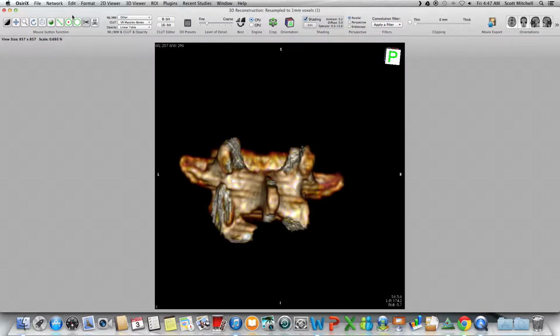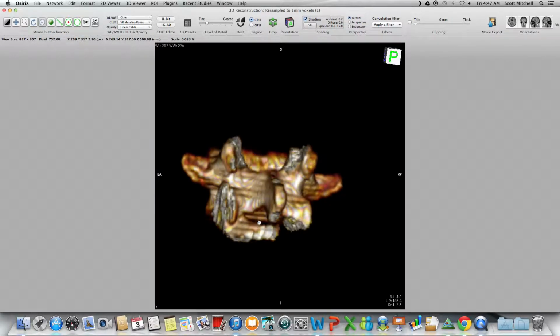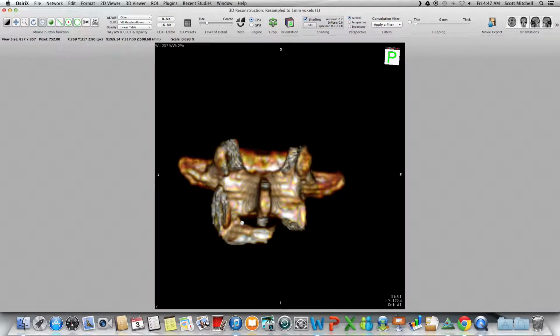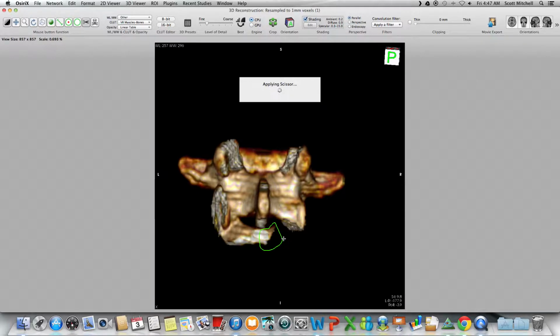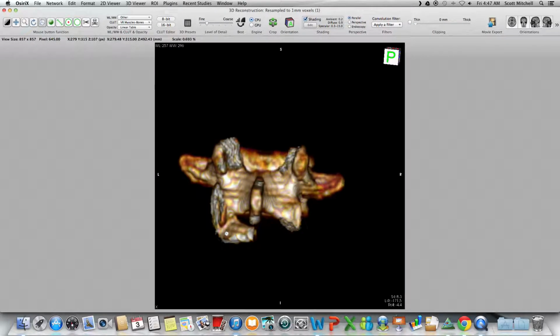Ooh, I think I took off some of that right there, so I'm going to click Control-Z, and it's going to put everything back. So yeah, just got to make sure that if you do mess up, that you recognize it. But as I said, the Control-Z is extremely helpful. Alright, so we just keep on moving just a little bit and cutting a little bit, just so that we don't make any of those mistakes. I think I cut off too much that time too. Yep. Okay. Let's go a bit closer.